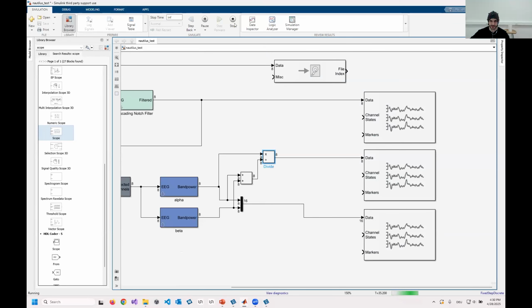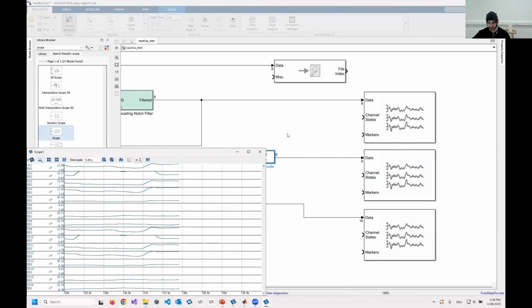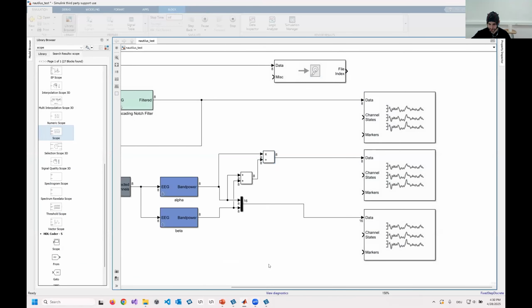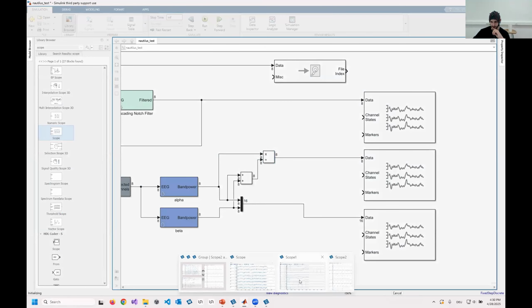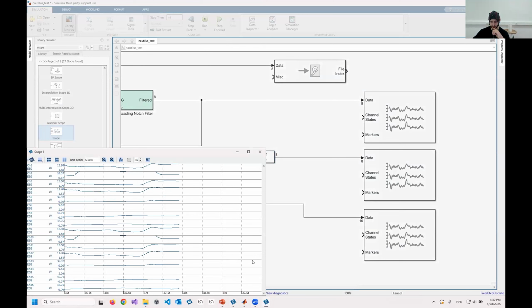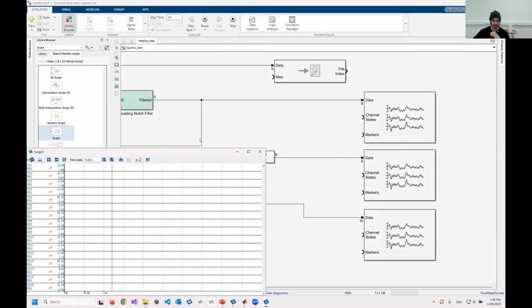It's like I still have a mistake in the last section. Then I'm going to work with the other part. You can still see, as soon as I close my eyes and clench my teeth, the power values are changing.